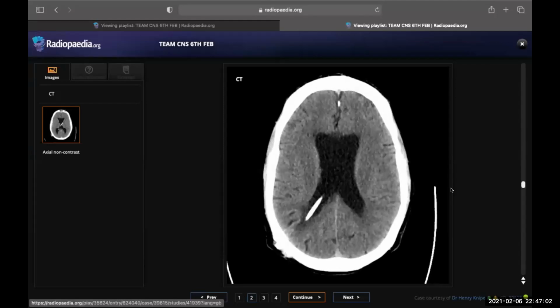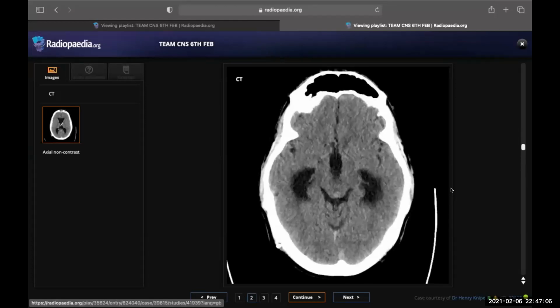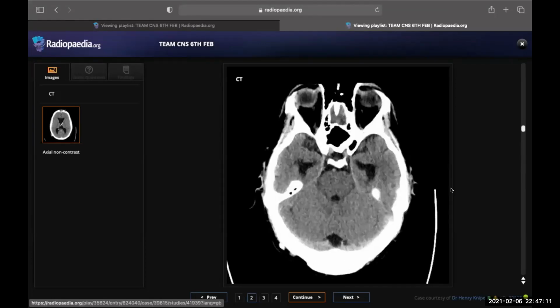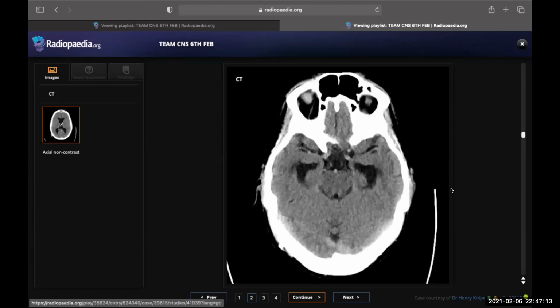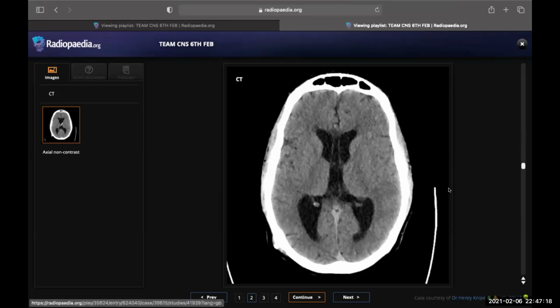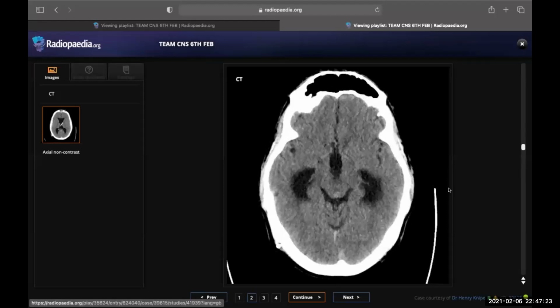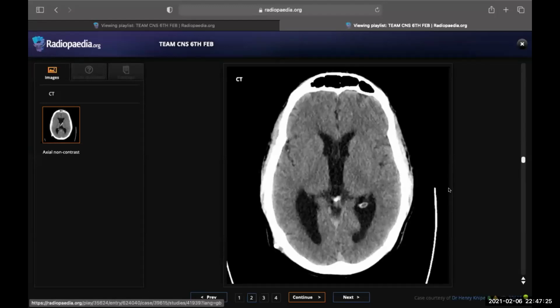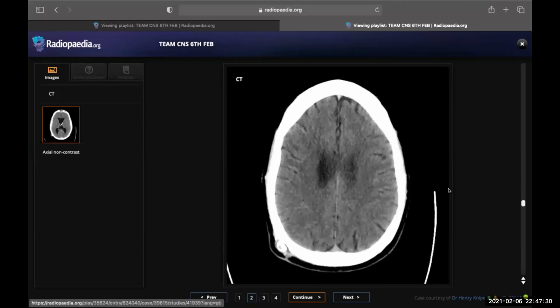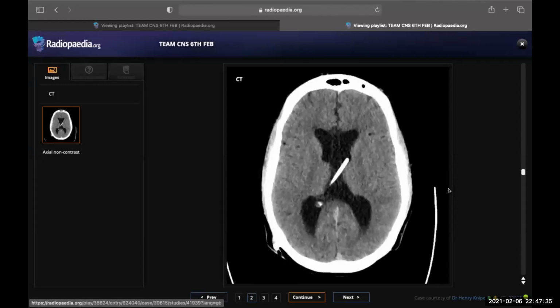There is hydrocephalus. Excellent. I'm seeing it as prominent temporal horns mainly. Good. So which means? It means that the shunt is not functioning well. Excellent. What's your next step? I will first compare with the previous one. The previous one was good. It was decompressed. So I don't see any transependymal spillage at this level. Okay, I agree.